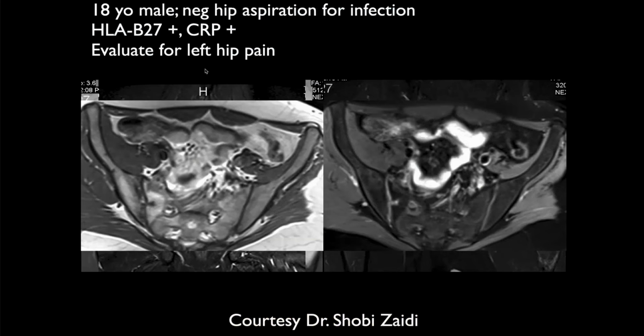Yeah. Right. So this patient's had, go ahead, John. Yeah, as you can see, the right is quite involved. The left is sort of fairly normal looking. Yeah, just like you said, asymmetric. Now this patient's had disease for a while. This isn't the early acute phase, so it'd be nice to have picked it up earlier.